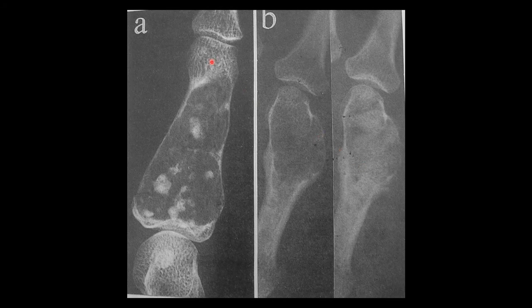following skeletal maturity. Here's an example of a phalanx where there is a lesion within the bone, an enchondroma. Again, well marginated, so you would think this would be a benign tumor. It's lytic with some calcific stippling. Calcification again occurs in cartilage, so we know that this tissue is cartilage, and this is an enchondroma. You get syndromes such as Ollier's disease, where there's multiple enchondromatosis, which distorts the growth of the phalanges and can cause deformity.